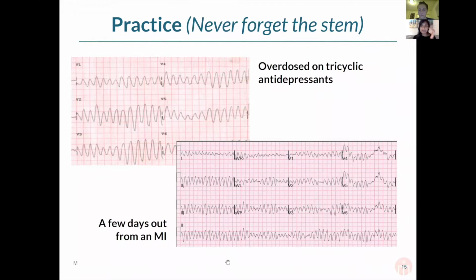So something to be aware of for this patient is that it looks like a wider complex because you're still seeing something a little bit more sinusoidal, but you're not seeing that same amount of amplitude. And I think that's really important to hone in on. You're not seeing that same amplitude and you're not seeing as much of a defined movement. This looks a little bit more like something's just puttering along. And it's a difficult distinction to make, absolutely.